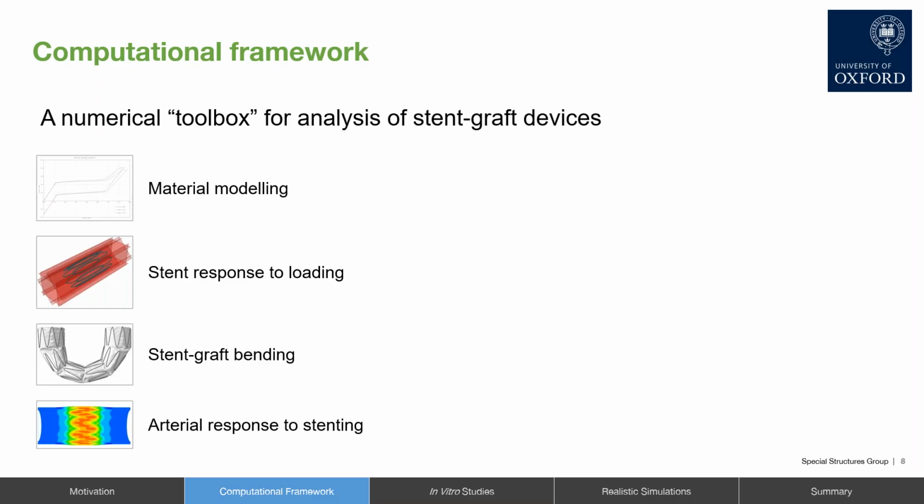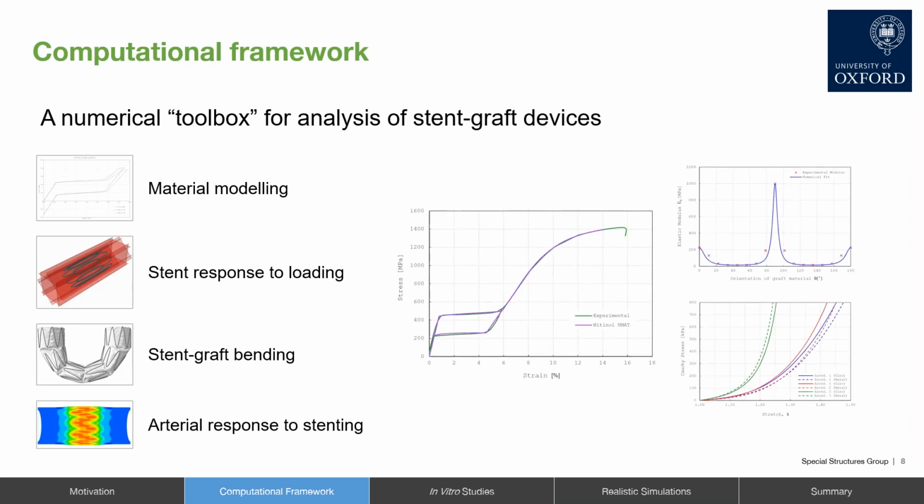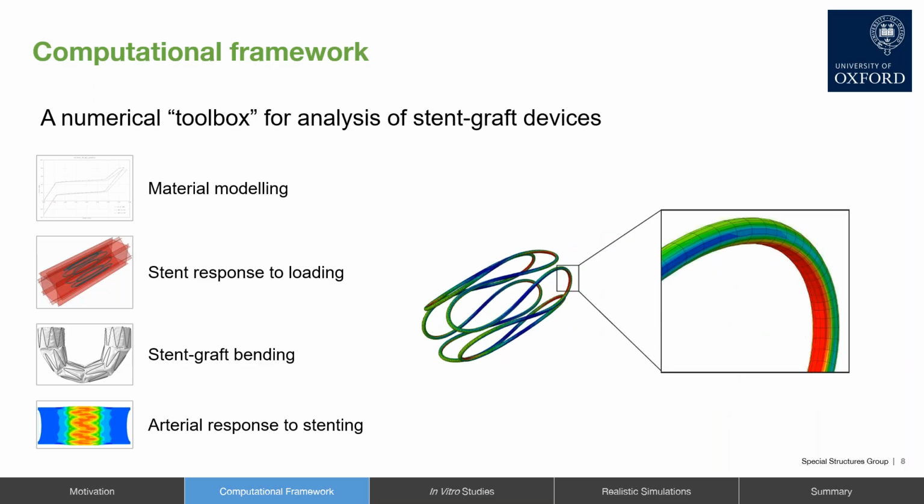Okay, now what we've developed here at Oxford is a numerical toolbox for analyzing stent-graft devices. And we've done this in a bottom-up approach where we start with the material models and build things up incrementally in an order of increasing complexity. So to begin, we look at the material behavior of each of the individual device components in the stent-graft artery domain. We then incorporate those material models and build up our simulations to study things like stent response to loading and what a device might undergo during packaging into one of those delivery catheters for minimally invasive surgery.